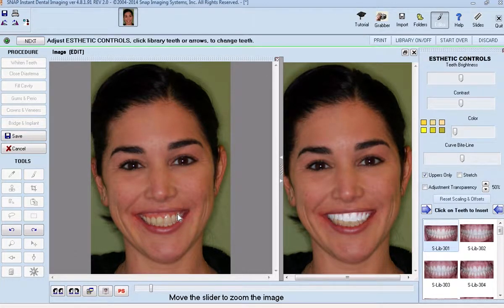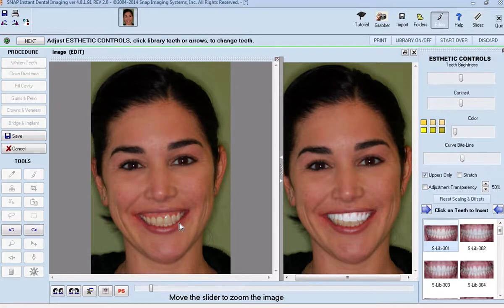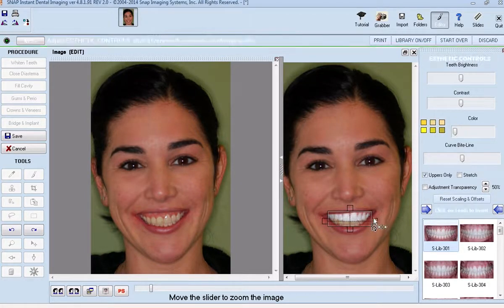Now, just so we know in this case, we previously treatment planned her using Snap, and at the end of treatment, we did crown lengthening to correct for the gummy smile and the cant, and we did 10 veneers, and lower Invisalign was just recently completed after the first stage. So what we are going to do first is I'm going to show you what we can do with this.